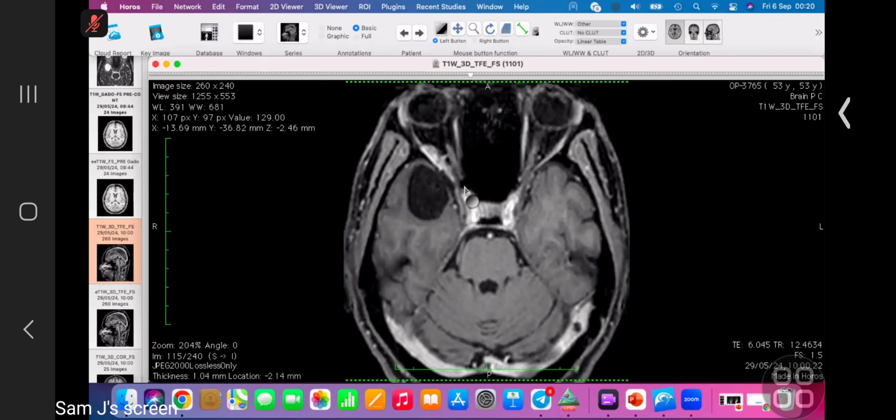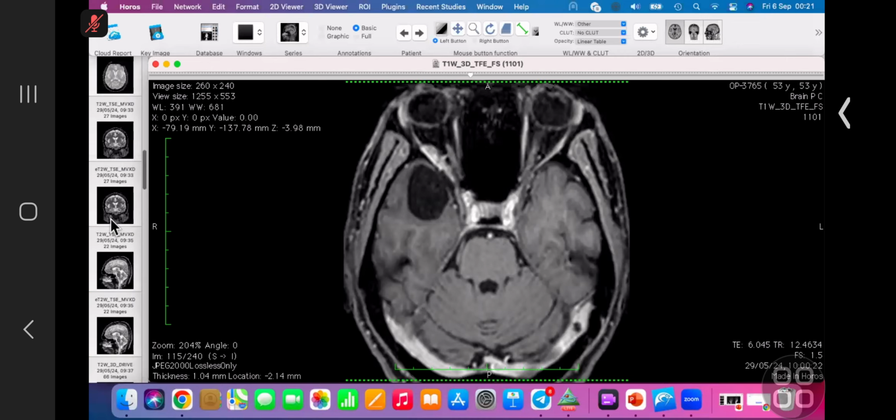What's the top 3 differential for this lesion? It could be due to enhancement. Yeah. Okay. Evident. Yeah. Let me just take over. Yeah, it is a little bit tricky case.